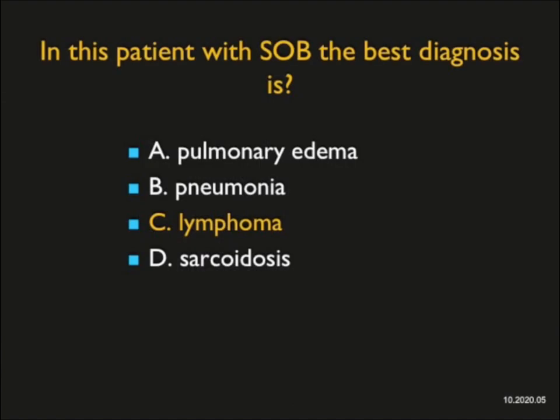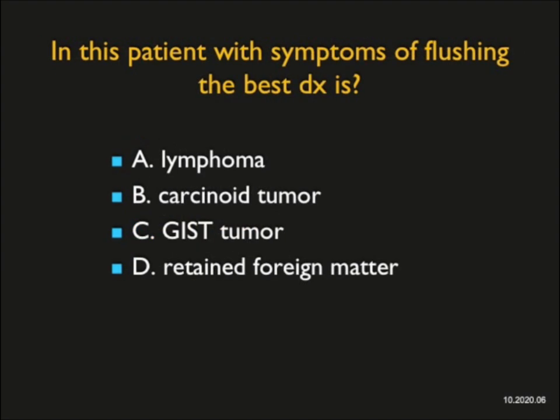A very unusual appearance for lymphoma, but one that does occur. This patient had symptoms of flushing, and the best diagnosis is, well, the truth is, if you say flushing, I would say carcinoid tumor without looking at the patient's images, but let's look at the images.